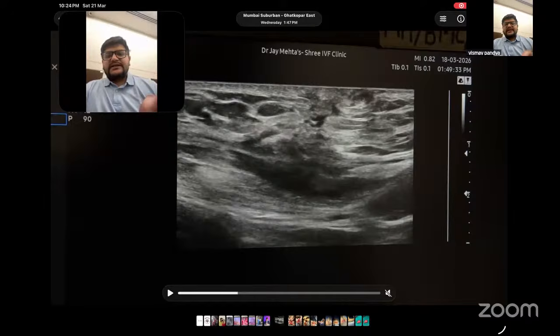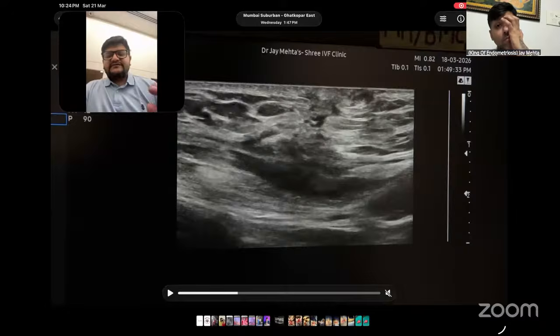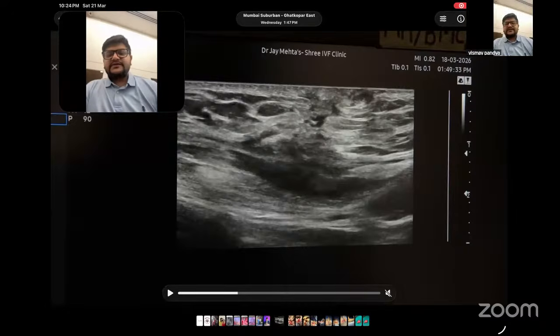The main point to remember is that these nodules can also be very small. Ideally, scar endometriosis is a very irregular lesion. When you see a very small lesion, sometimes in the subcutaneous fat or in the rectus sheath, which is a small round dot with regular margins, the main differential diagnosis you should also have is something called a scar granuloma.